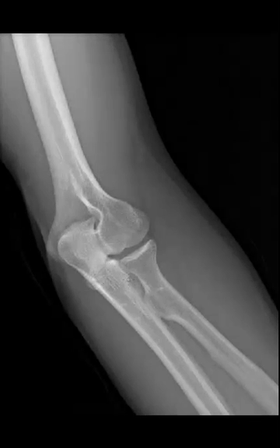You can see that it doesn't exactly look like the AP, and it definitely doesn't look like a lateral. Now this projection will allow you to see through the radiocapitular joint very, very well, as well as see the radius and ulna in a slightly different view. Now let's just begin again. Here is the humerus, here is the radius, and here is the ulna. Remember that the ulna is on the medial side, and remember that the radius is on the lateral side. So when we come up to the humerus, this is the lateral epicondyle, while this is the medial epicondyle.